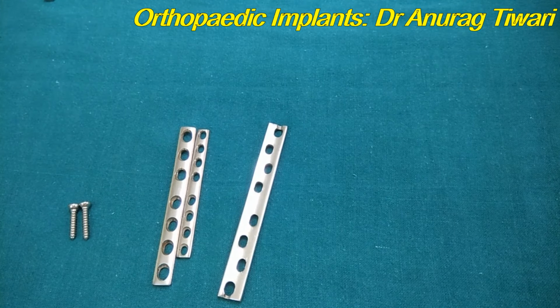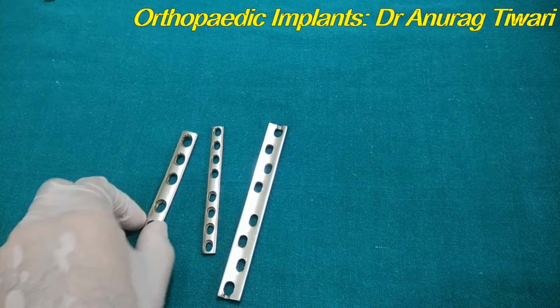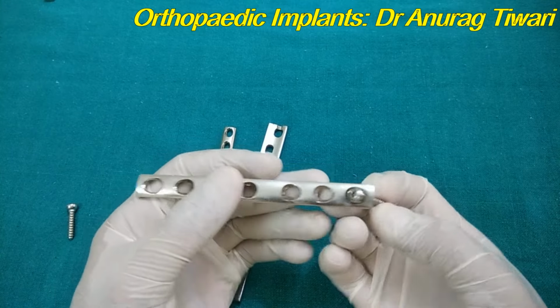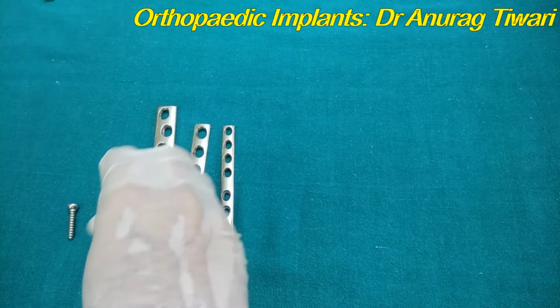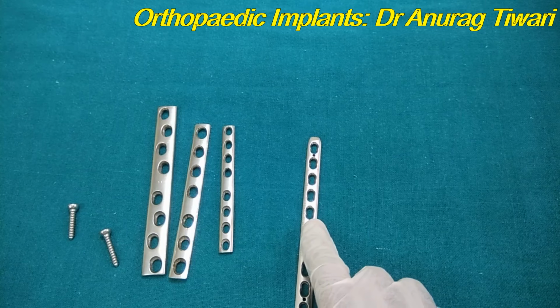Now again there was a difficulty in the LC-DCP also, because when you put screws, the screws can toggle. The screws can toggle like this, you can see. So this creates problems with implant failure. This creates implant loosening. So in order to solve this problem, they came with a new mechanism, a new plate, that is the locking plate. So that's why the locking plate came into the picture.